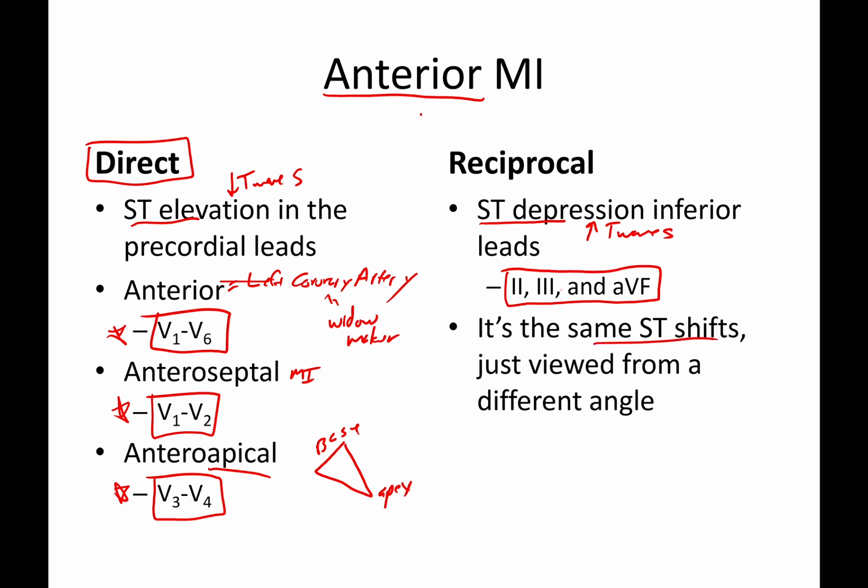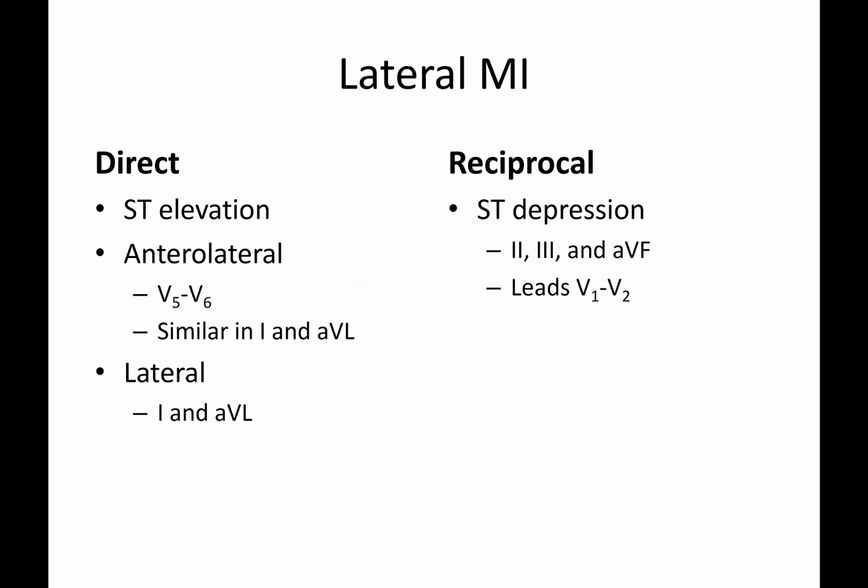And it should be the same amount, just a different angle. So if you have a ST elevation of 3 millimeters in V3, V4, you should see ST depression of about 3 millimeters as well in those leads. That's the general concept.